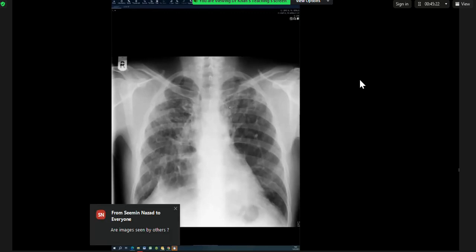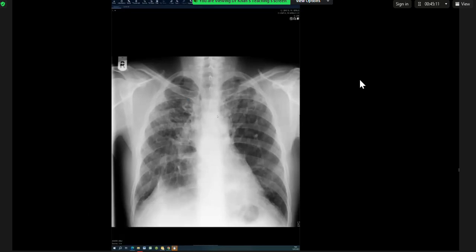So focus on describing that first so you can get all those points. You want to say the hila are being pulled up and there is linear shadowing, and you're thinking that there is upper zone fibrosis here. Now you're thinking of all the causes that cause upper zone fibrosis. The coalescing, I don't see. You want to see more mass-like areas, dense consolidations that look like they're coalescing together to go down the PMF, the progressive massive fibrosis route. That certainly happens in pneumoconiosis, but I don't think I can convince myself that I see it here. I do see fibrosis, but that's pretty much it.